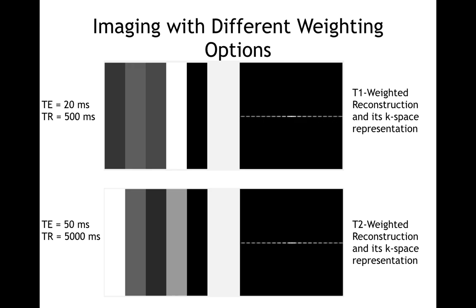It can be seen that the signal intensity of fat tissues is the highest. This is expected because the T1 constant of fat tissues is lower than others, which means that fat tissues are able to recover quickly after the excitation, whereas other tissues cannot recover their longitudinal magnetizations as much. For example, water has much lower signal intensity because it has the highest T1 constant.